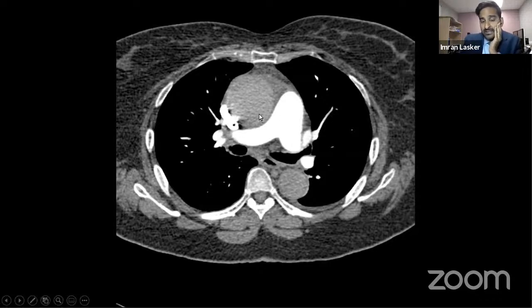Right, so let's get back to anatomy. This is the aorta. This is the aorta. This is the main pulmonary trunk and see in the pulmonary arteries, the contrast is very, very bright. That's the whole point of contrast, and it's sitting within the pulmonary arteries. So therefore, this must be a CT pulmonary angiogram. We're looking for a PE in this particular situation.